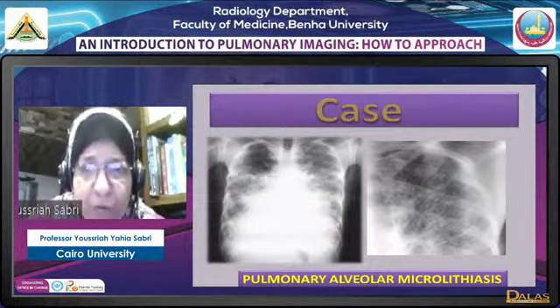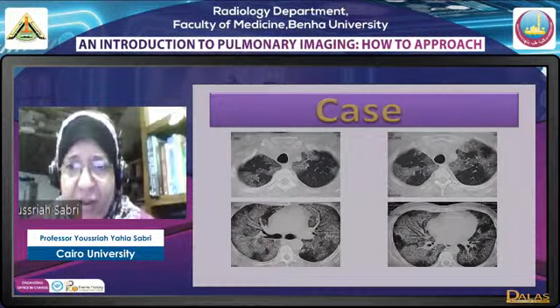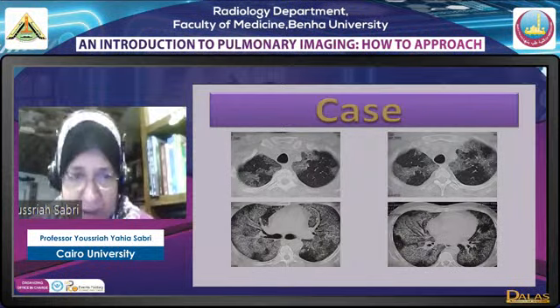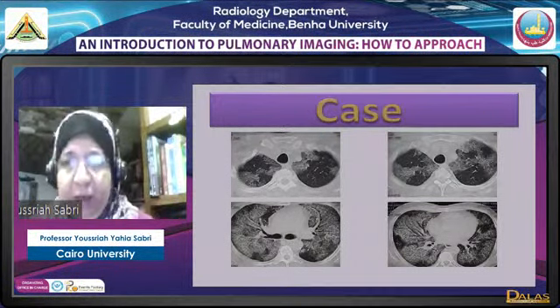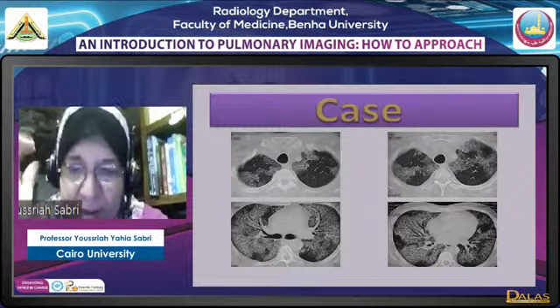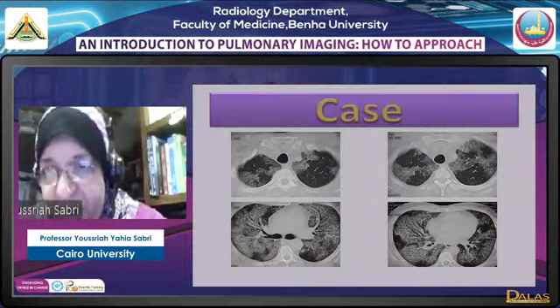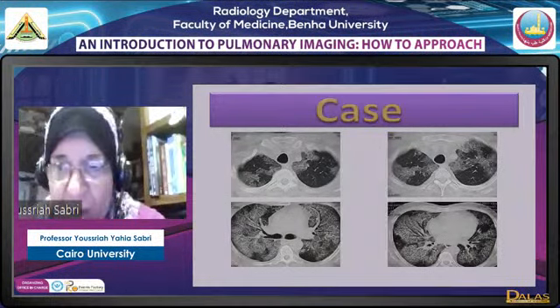Now again, we have a diffuse bilateral disease showing the classic crazy paving. You surely all know the crazy paving appearance by now. Crazy paving is the summation of three things. We have ground glass, and through this ground glass we see prominent interstitium. This interstitium actually is prominent inter and intralobular.